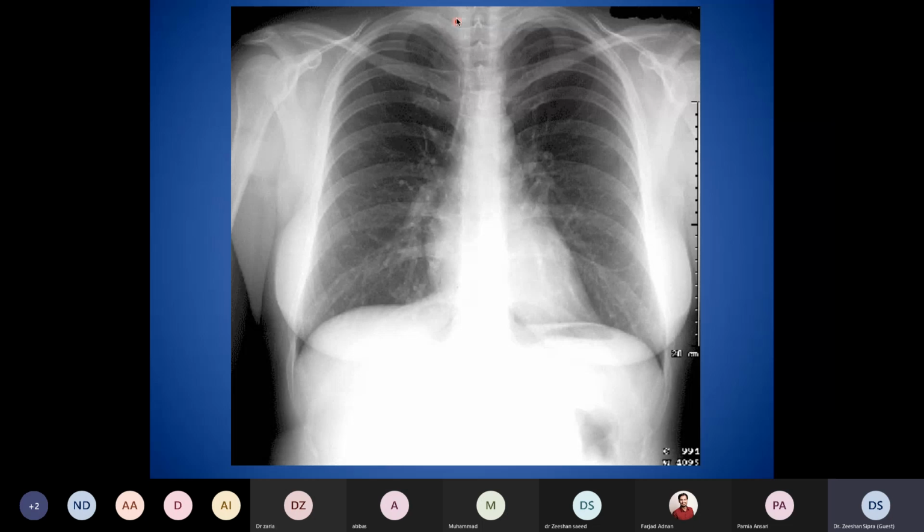I'm drawing for you the first rib over here. It starts over here, it goes round like this. Then the second rib goes over here, it goes round like this. And the third rib goes like this and comes over here, anterior. This oblique part is the anterior part of the rib, and this horizontally looking part is the posterior part of the rib.